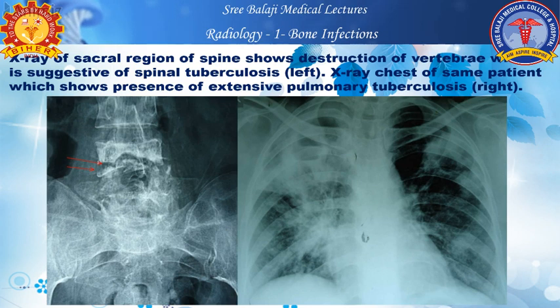This picture shows prevertebral soft tissue widening of tuberculous abscess from the adjacent bone infection. A different manifestation of tuberculosis: here it is purely a sclerotic vertebra with the destruction of the right inferior aspect of the vertebral body, and the vertebra appears sclerotic. The primary, as shown in this picture, is typically a cavitary lesion in the right upper lobe with the fluid level and fibrosis.